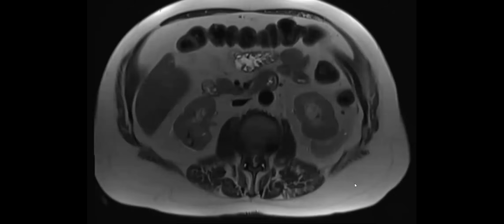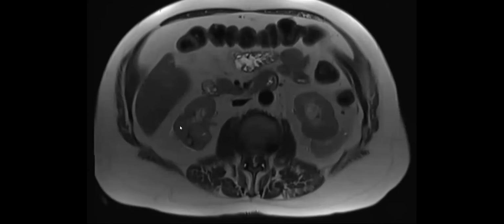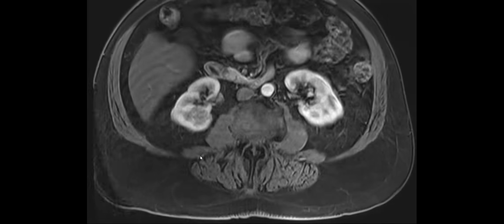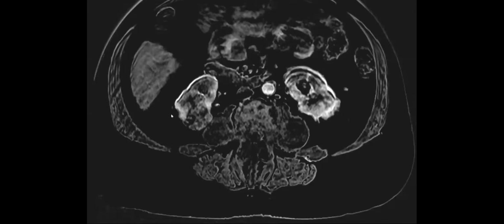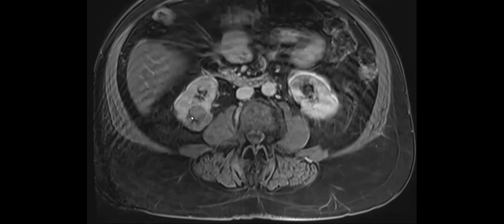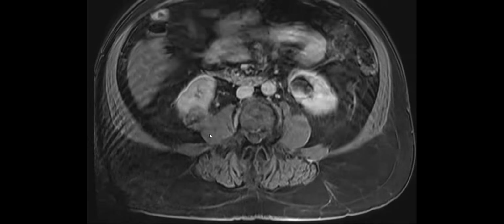Cool. So this was a case of a renal mass. You can see it here on T2. Here it is on the arterial phase. Okay. You can see that's definite enhancement on the subtraction images. Here's the venous. Here's the delay. Okay, and it did not have microscopic fat. It did not have macroscopic fat. So we basically said this was an RCC, and that's what this was.